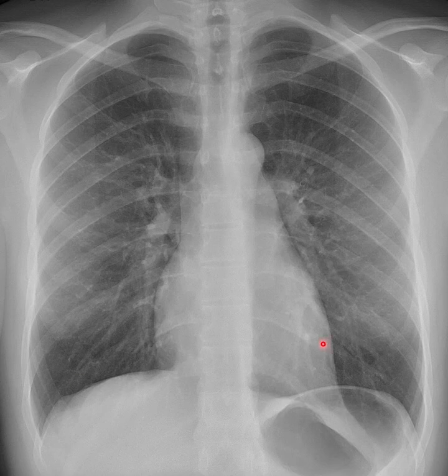Hello, this video is for radiologic technology students to learn the radiographic criteria of a chest x-ray and how to assess a chest x-ray for diagnostic quality. So the first thing that we want to do for a chest x-ray is to identify that we have not clipped any of the lung field and the pertinent anatomy that is in the lung field.